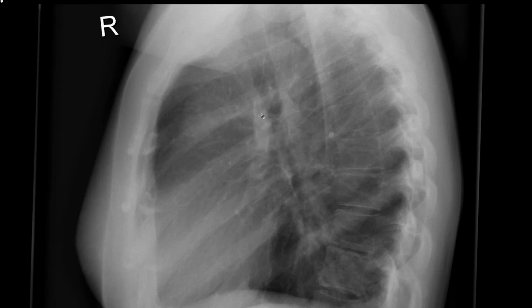Sometimes I've seen two contours posterior to it when there's this left lung isomerism. So the left PA is arcing over the top of that bronchus and going behind it. Sometimes you'll see two shadows there for the left and for the additional right one.